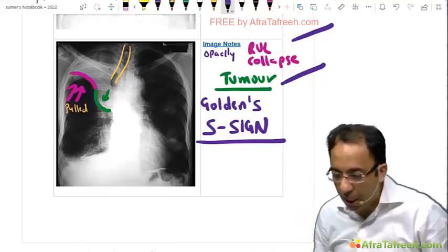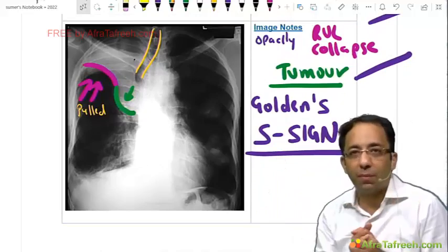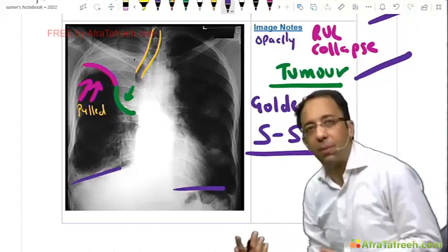Now Sundari is asking, sir, why are the lungs appearing black? You tell me. Both the lungs are hyperinflated, more black, more air. Even the diaphragms are flattened. What could it be?